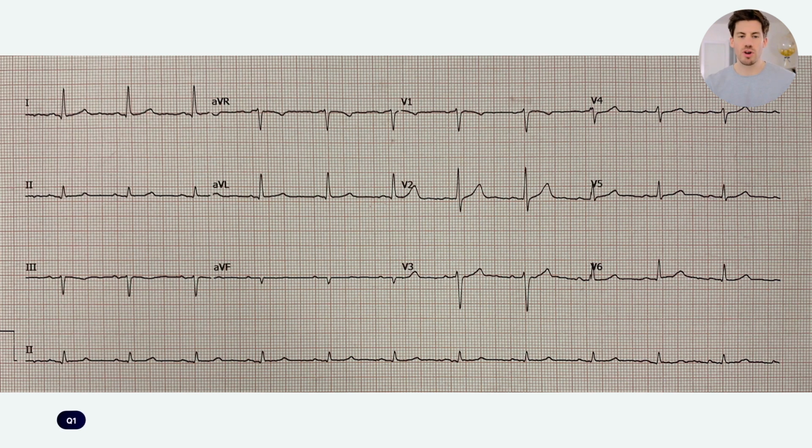So we're now going to look at rate. Just based on this ECG, what is the rate? Think about yourself now how you may calculate it if you know, and then we will give you two methods in which you can calculate the rate easily on ECGs. So take a moment now to see whether you can work out roughly what rate it is.